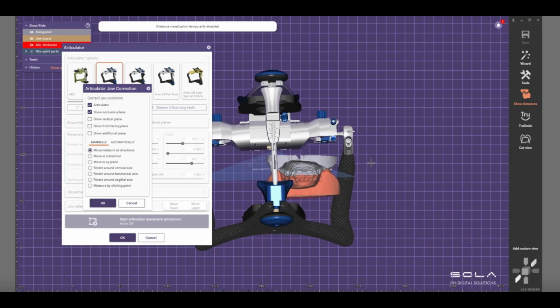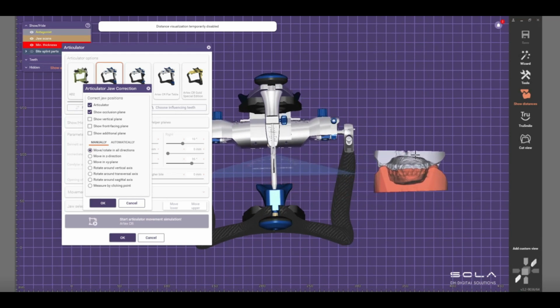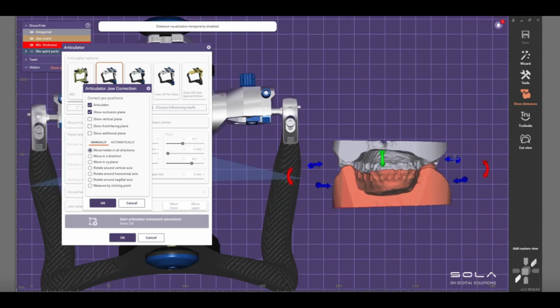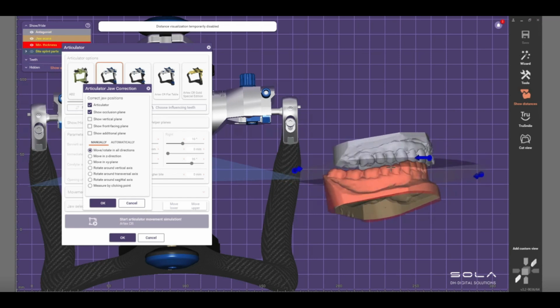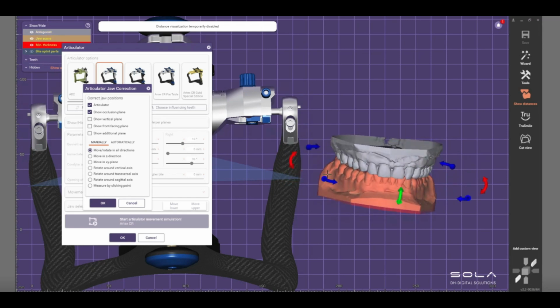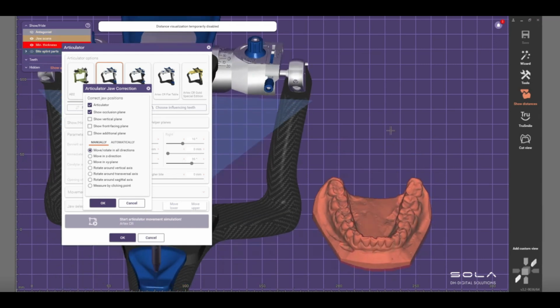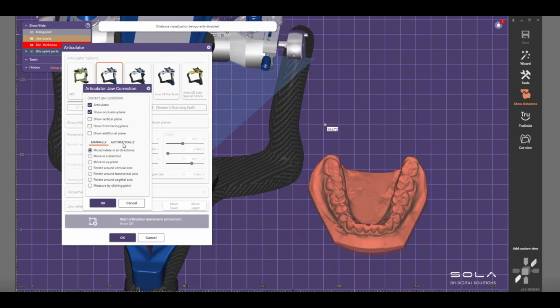And there, to move this one, you can move it like that just by clicking on it, and to rotate, you click on your control key to move it. Control, and then you can move this using the arrow. When you do the control, it gives the arrows. There, you hit A to hide your antagonist, and then you can click on your automatic here.